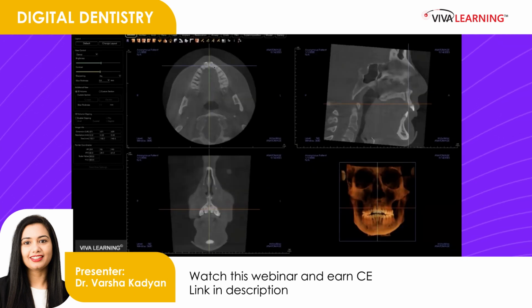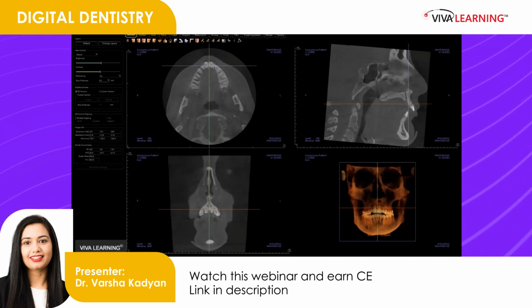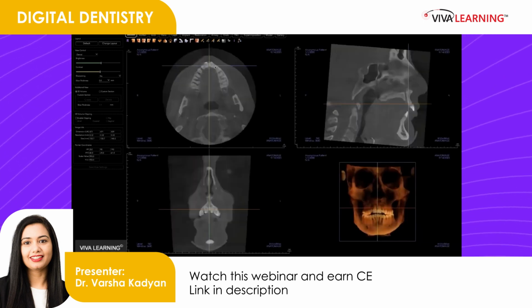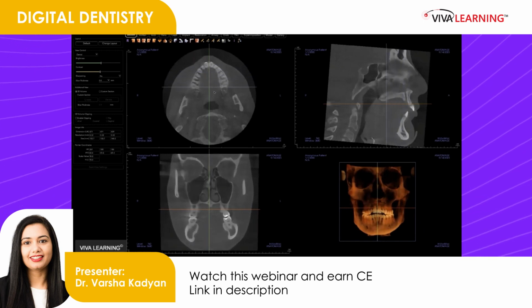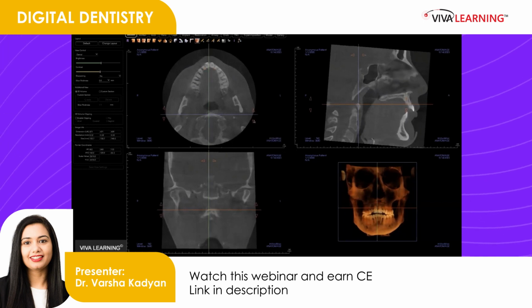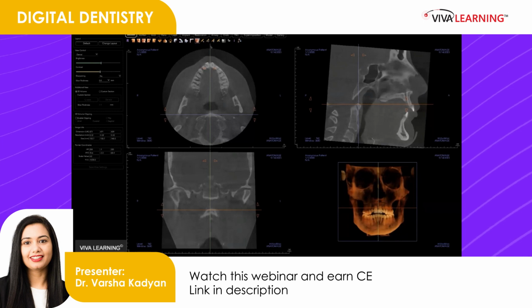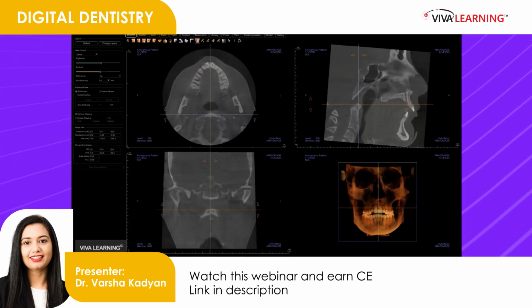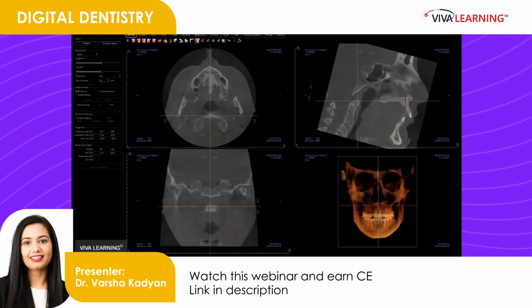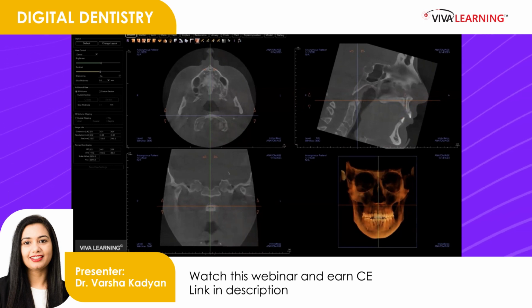The importance of reorientation is to make sure that you align your anatomy on the basis of the orthogonal planes here. How I like to do it is, I make sure that the symmetry is maintained bilaterally on the right and the left side. This is the medial line, the anatomical midline. And I like to keep my hard palate parallel to the floor, or parallel to the orthogonal plane here.